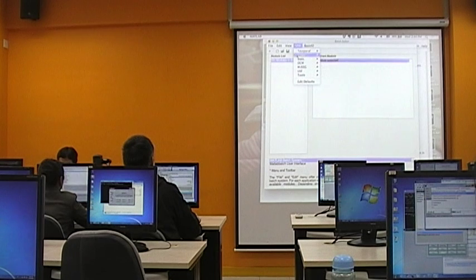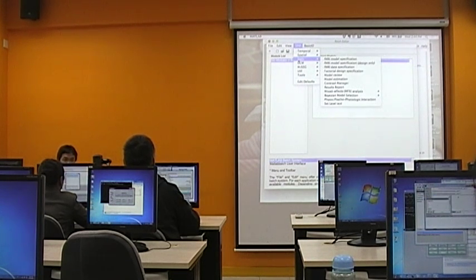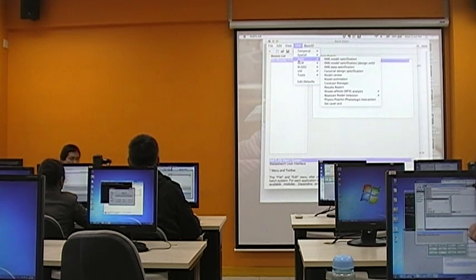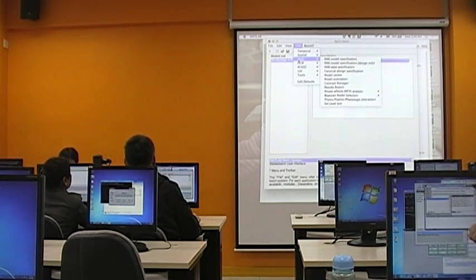So now, do you really want everything before we move forward? Not this time. You don't need to run. This is just as a revision. Okay. So I just follow you through the whole thing. Yeah, supposedly you have already run this. Or even if you are not here on Monday, I think the folder also has the necessary files for you to use as an input for the first level and the second level analysis.